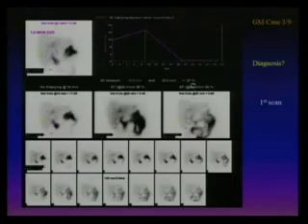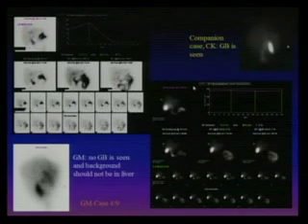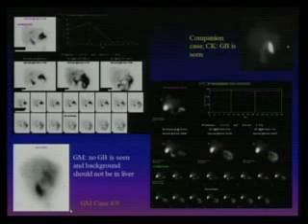And then when they cross-read, I realized, no, I don't think I saw the gallbladder. And this is just to give you the normal gallbladder position. And this is the whole case. So lateral view, very important. Always look at the lateral view, because sometimes it can be very confusing. It can overlap with the CBD, or you just get confused about whether it's the gallbladder or not. So in this patient, you can see the duodenum here, there's no gallbladder. The gallbladder should be really anterior.